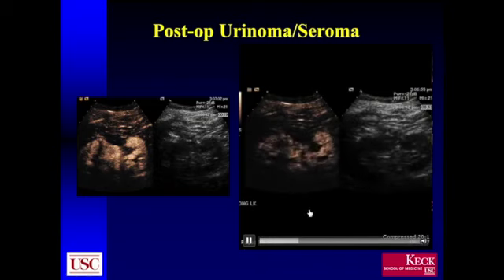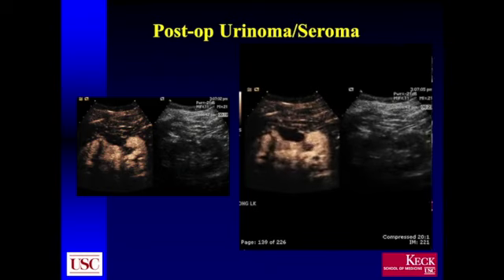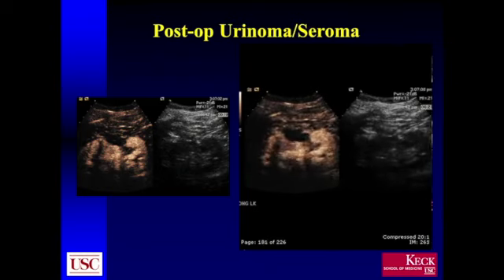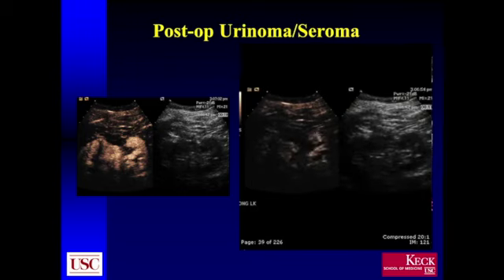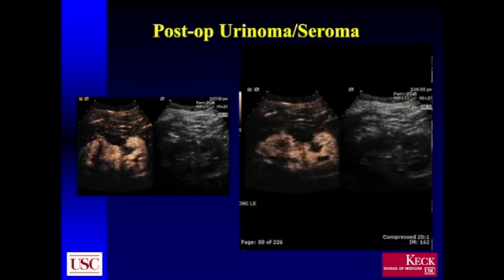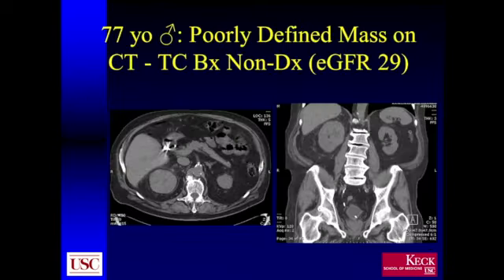This is by far and away the most common sequel rather than recurrent disease, but obviously these patients are being monitored for recurrent disease, and contrast ultrasound can be quite valuable, again, particularly in patients who have had transient or post-operative renal failure.